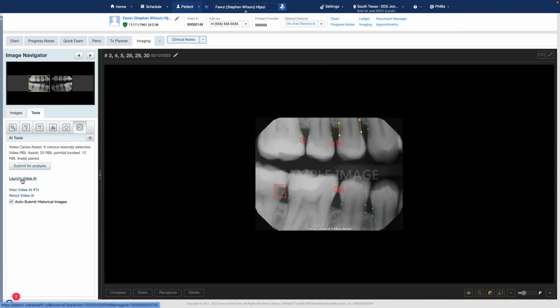And it's a very nice little tool if you wanted to use it. And I know that they're coming with more and more features for this in the near future.